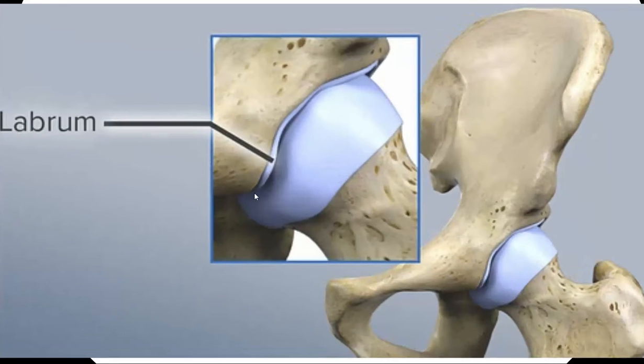The acetabular labrum is an important structure within the hip that provides joint stability. Now, labral abnormalities are a significant factor in the development and progression of degenerative joint disease, so that's why it's important to pick these up early, because you can modify the progression of hip osteoarthritis if treated. Those patients with labral abnormalities may have acute or chronic symptoms, and they're widely ranging intensities and locations and duration, so it's a nightmare to diagnose clinically. The findings are highly variable, and there are numerous regional anatomic structures that can make the clinical evaluation very difficult.